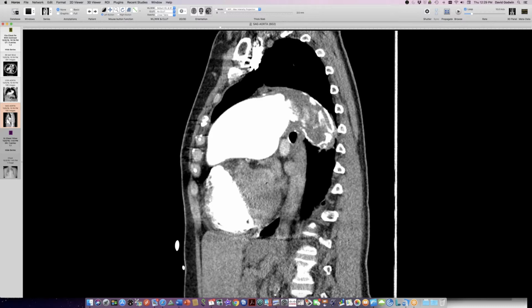Because I'm telling you, I have to write something up because it is really hard. I mean, we all think intimal thrombus and in situ thrombus like this case where you have that layering calcification, but in some areas it creeps into the distal vessels and it occludes them. I've called some of them mixed, and then the surgeons come back to me like, dude, this is all in situ thrombus, this is not CTEPH. And I'm like, I don't know how you tell in a lot of cases. Is it mixed disease? Is it one versus the other? I don't know. It's hard.